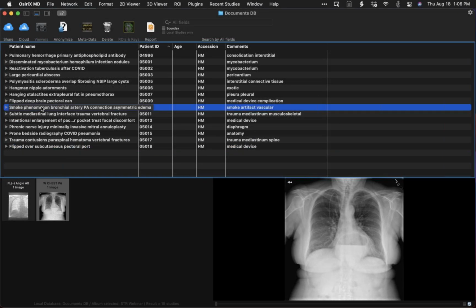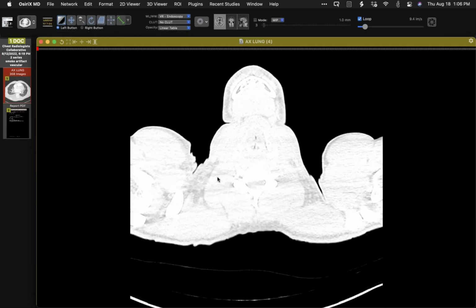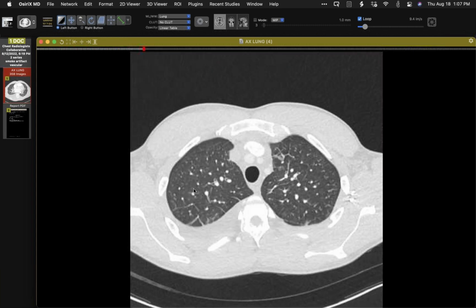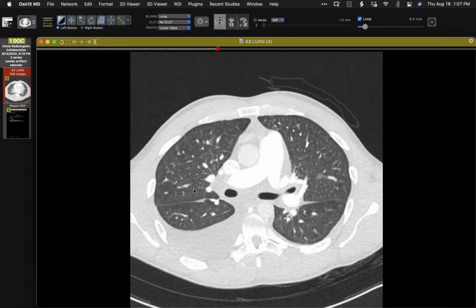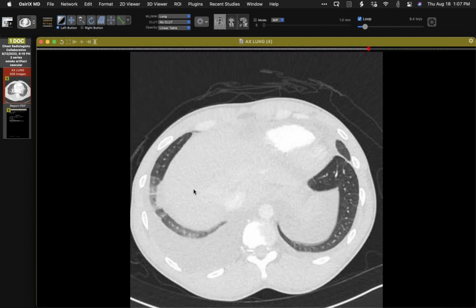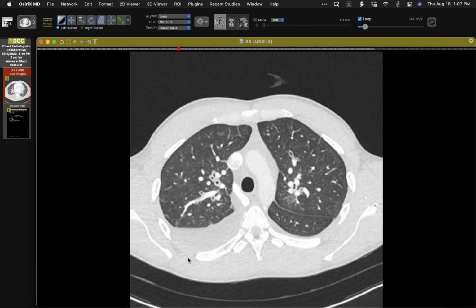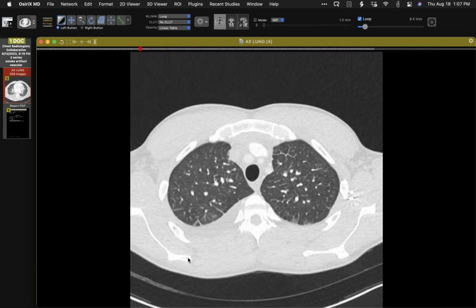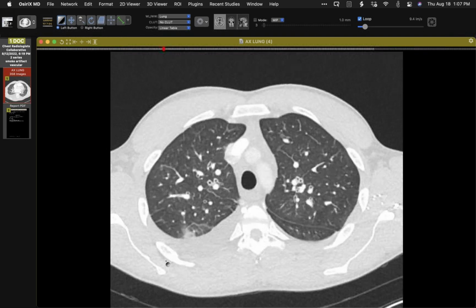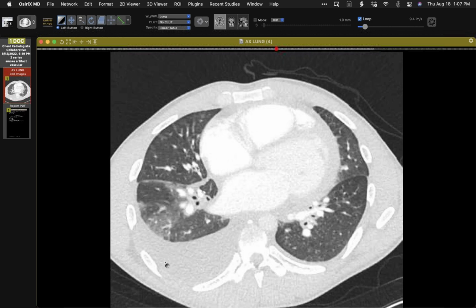Okay, I'm going to show you a really interesting case here. So this relatively young person came in, and the history we got was likely cardiomyopathy attributed to, perhaps at least in part, methamphetamine abuse. So the findings right off the bat are florid interstitial lung edema, a very nice example of peribronchial fluid cuffs, septal lines, and subpleural edema related to the fissures.